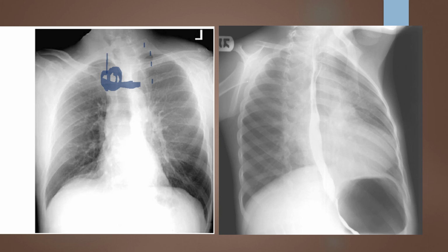Mid-sagittal plane rotation, we pretty much covered with the mid-coronal. If I look at mid-sagittal plane tilt, really this mid-sagittal plane is nearly perpendicular. If it was truly rotated to 45 degrees, I would be evaluating that clavicle to apical line as well as the manubrium to help me differentiate that. So this is definitely a repeat exam. Adjust the technique, rotate more, correct the mid-coronal tilt, and then I can get an acceptable image.